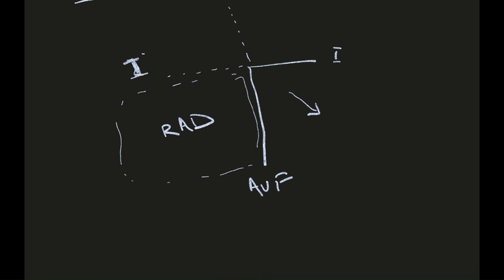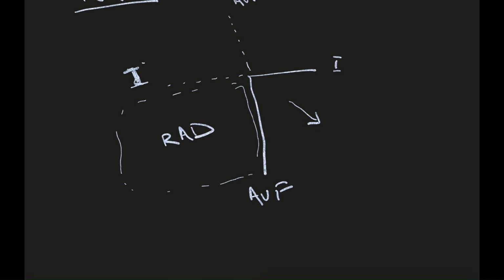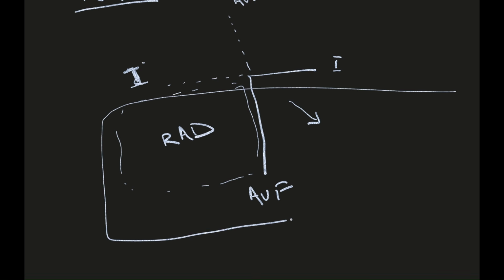Here, which axis becomes negative? Look, this whole section of AVF is positive. Fine.